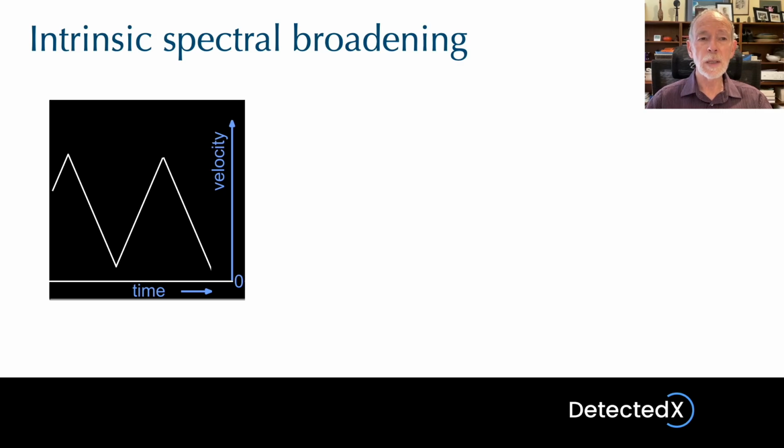Now we come to a completely different artifact. This was discovered by a sonographer doing a higher degree. It initially met with significant skepticism, but subsequently he was proved to be absolutely correct. I've obtained this signal using what's called a string phantom. This is a moving string phantom used for testing and demonstrating Doppler instruments.